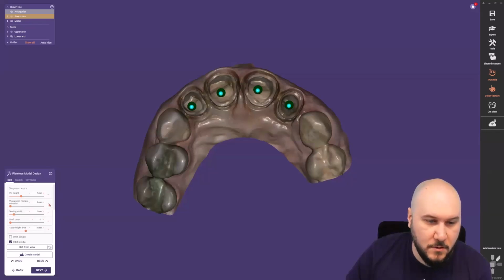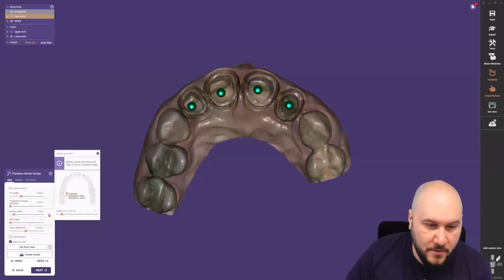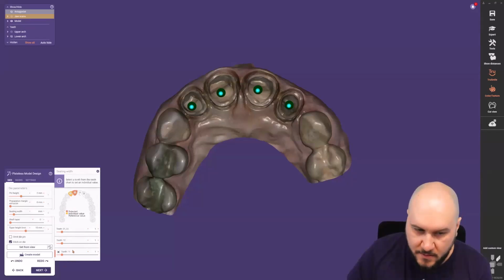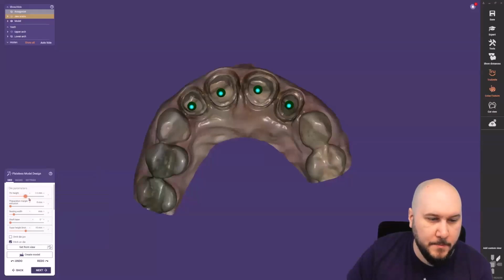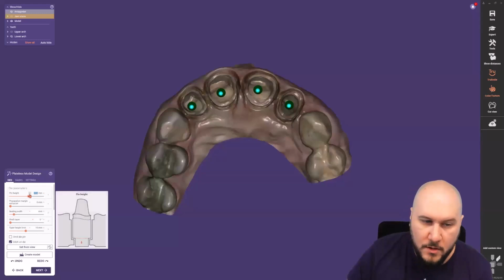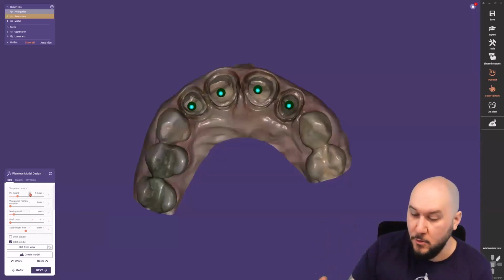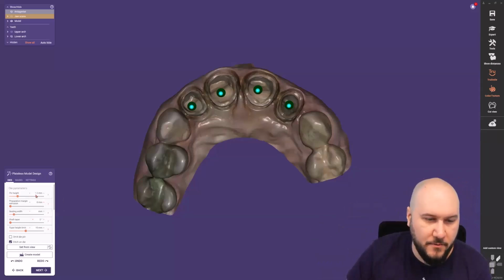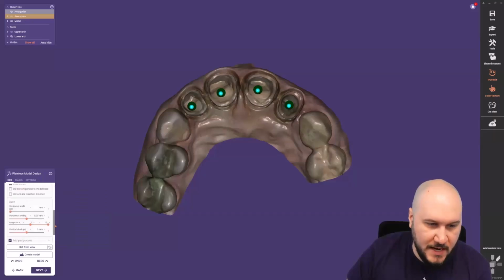And you can see also that wherever you have this small arrow, just enlarge it, set your tooth individually, what you need, and then you can toggle these different kinds of parameters. Sometimes this is saved, like here. You can also right click and directly reset the current value to 0, or right click on the arrow to set it back, then it's also set to the default again, if you have switched different things like this.